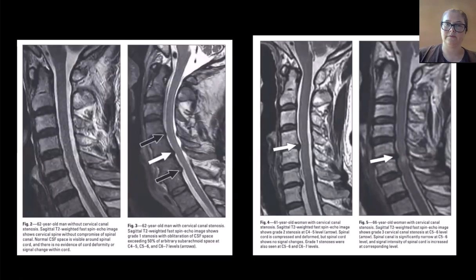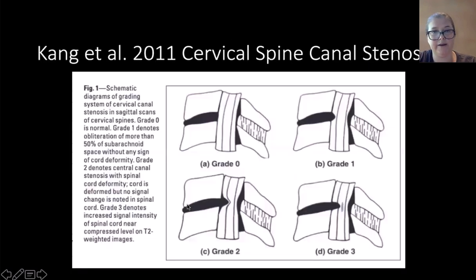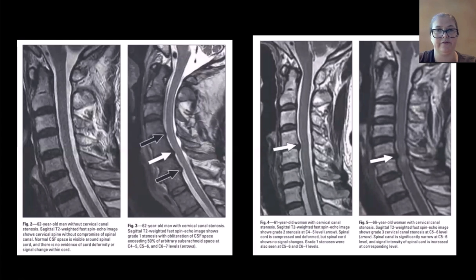Okay, so an example here. I guess this is sort of what we were talking about, right? This person doesn't have a really straight spinal canal, but you've seen other cases where they've got just as much space anteriorly as posteriorly. This person has lots of CSF here. Anteriorly it looks like a little bit less, but they're still calling it normal. They still see CSF around both anterior and posterior aspects of the spinal canal. There's really no degenerative change. They call this normal.